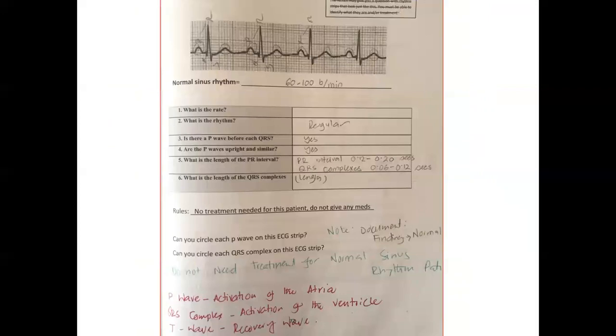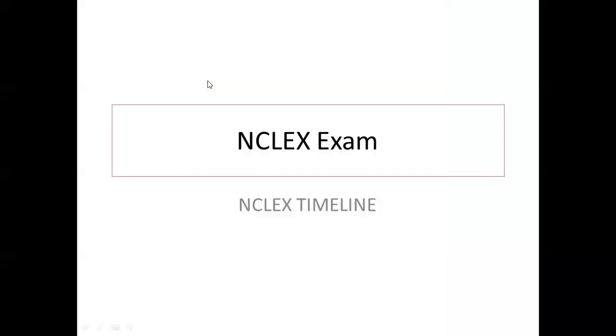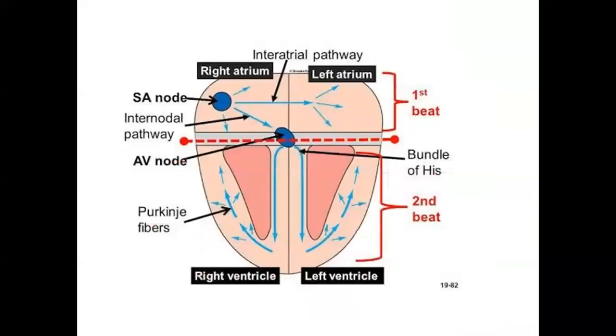So first one, in this picture, we can see this is the P wave, QRS complex, and T wave. This is the normal EKG. The same events here, and here too. So this event is a normal sinus rhythm. So, normal rhythm or normal sinus rhythm. Why do we call it sinus rhythm? Because you can see this is the SA node. It is the special tissue inside the heart. They can produce the impulses.